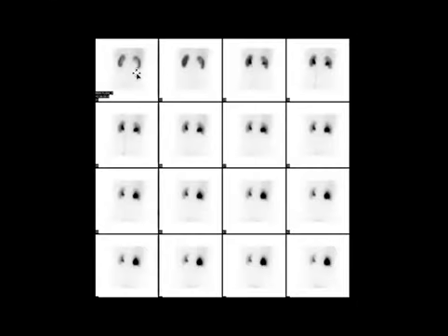When we look at the function, it is prompt. The left kidney excretes the tracer promptly into the bladder. They should have moved the camera a little bit more inferiorly, as the urinary bladder is not in the field of view. At the end of these images, we find that the left kidney has emptied completely. The right kidney shows stasis, just like the previous case where we saw right-sided UPJ obstruction.